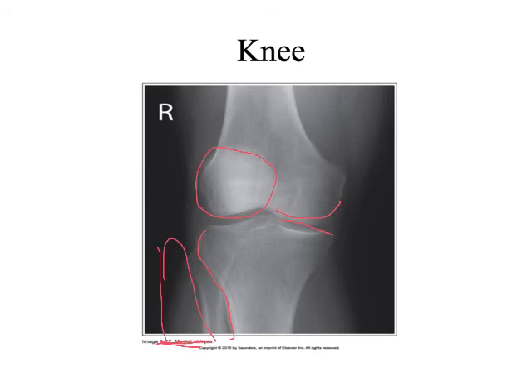Let me grab the bony guy. But if it was lateral, wouldn't the fibula be more behind? I think it's a medial oblique, but it hasn't been obliqued enough. And that's apparent because of the position of both the fibula and the patella.